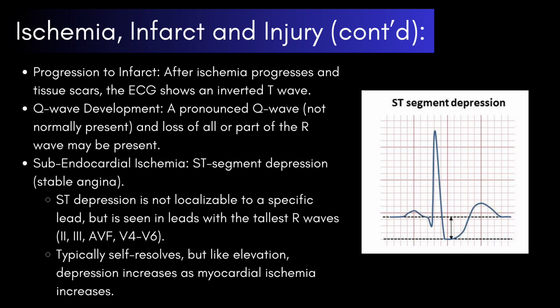ST depression is not localizable to a specific lead, but is seen in leads with the tallest R waves, leads 2, 3, aVF and V4 to V6. Typically self-resolves, but like elevation, depression increases as myocardial ischemia increases.